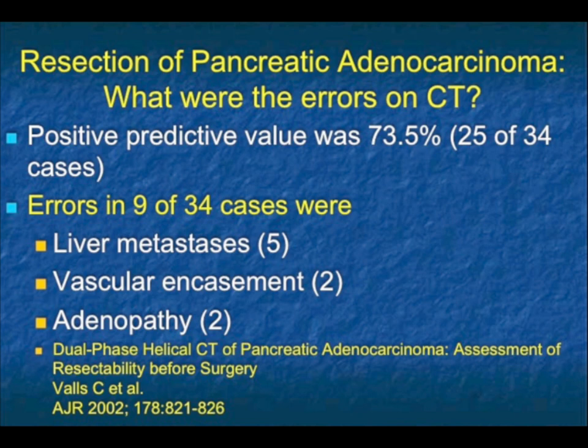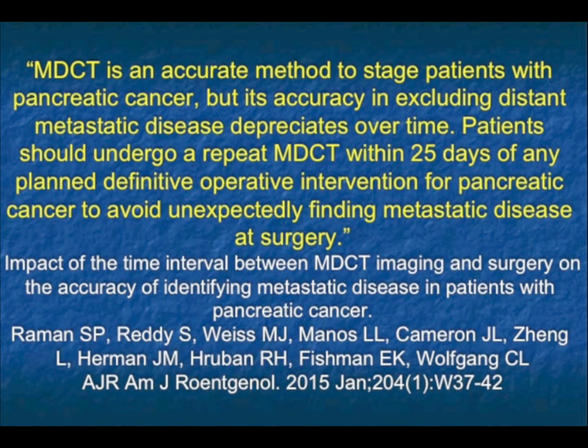But of course, with pancreatic cancer, you can have nodes that are 2 centimeters and are inflammatory, and nodes that are 5 millimeters and are positive. Remember, the typical surgeon needs to get 20 to 30 nodes for pathology to really get a good nodal sampling. We do not make a patient unresectable based on the presence of adenopathy.